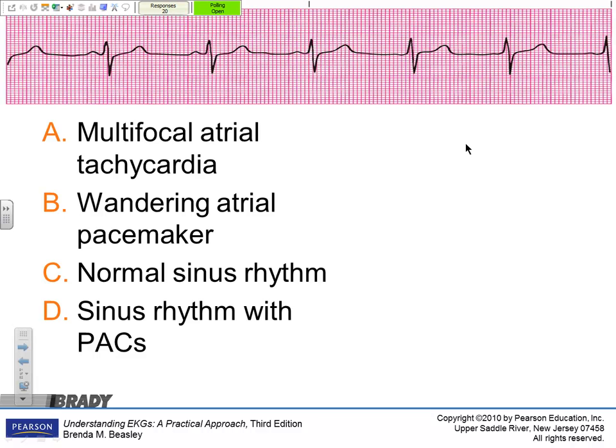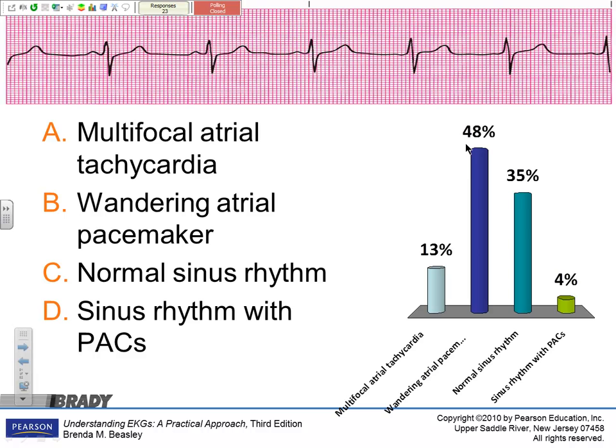Oh, this was too easy. What else should I put in there instead of tachycardia? Should call this sinus brady, shouldn't I? Different P waves. Look at these myself. Here we see a P wave, here we don't. Not really here, there's a P wave, there's one. Some of these look consistent, but two of these don't. So that's going to give you a wandering focus here.